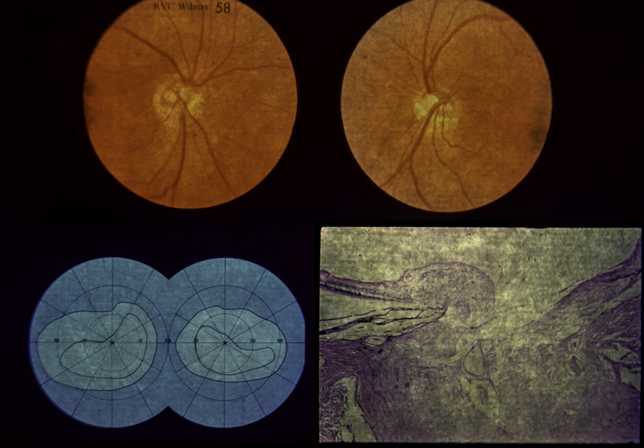Both optic discs have an exaggerated oval appearance with the vertical axis directed obliquely. The upper temporal portion of the disc lies anterior to the lower nasal portion. The retinal vessels emerge from the upper aspect of the disc rather than centrally or slightly on the nasal side, and proceed nasally before turning temporally. Inferior to the actual disc is a hypopigmented conus.